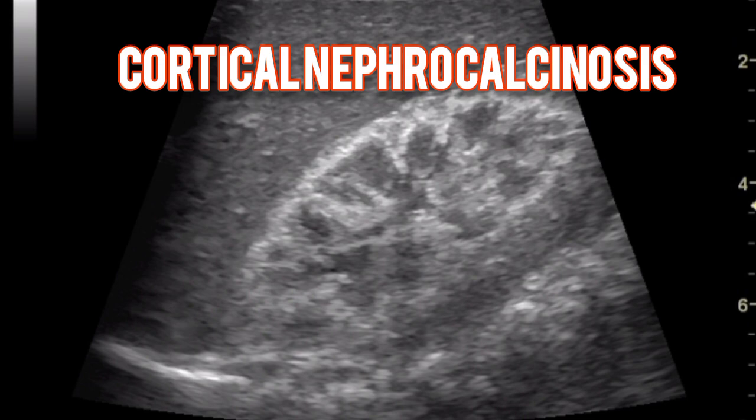Cortical nephrocalcinosis. Sonographically, cortical nephrocalcinosis is seen as increase in cortical echogenicity, which may be associated with acoustic shadowing. It is usually diffuse and bilateral. The causes will include chronic hypercalcemic states, acute cortical necrosis, chronic glomerulonephritis, ethylene glycol poisoning, rejected renal transplant.